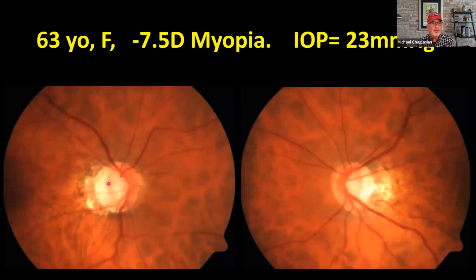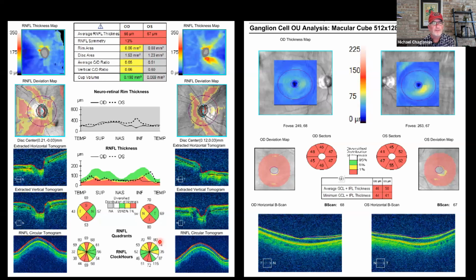Next patient is a 7.5 diopter myope, pressures of 23, had many years of routine contact lens and eyeglass examinations. Pressures before this were just at 20 or a little bit under 20. You see the classic obliquely inserted disc and a little bit of peripapillary atrophy. Both discs there. I'm not really pointing anything to the nasal side. It was just really to look at the discs there.